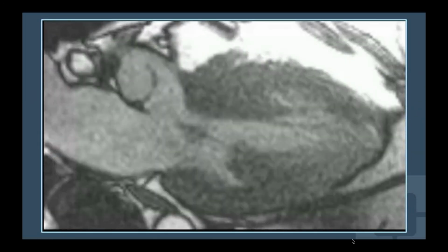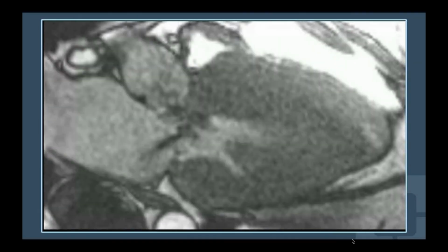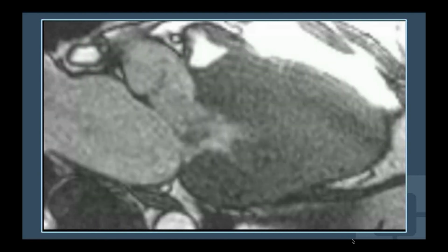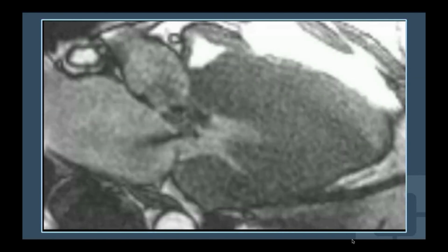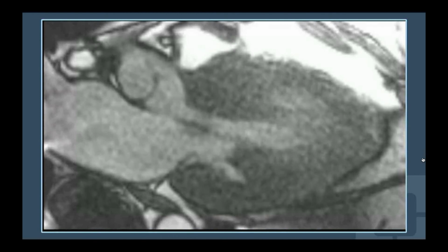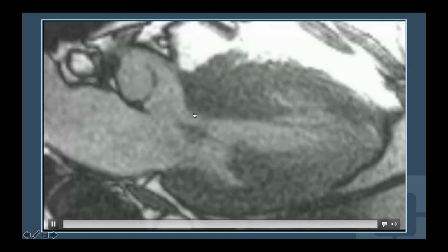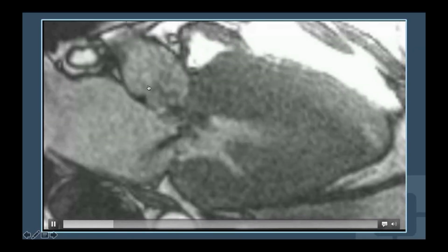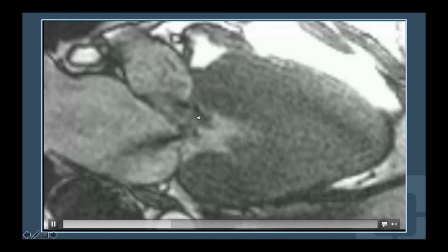So this is a pretty straightforward, just severe, extensive hypertrophic obstructive cardiomyopathy. You can see the severely thickened left ventricular myocardium, and then you have a lot of the other findings that go with it. You have the outflow tract obstruction with high velocity turbulence, and that signal loss going out starts below the level of the valve. It starts really at the LVOT.